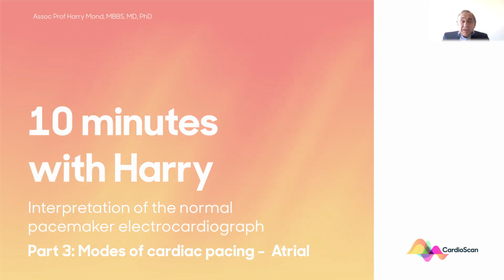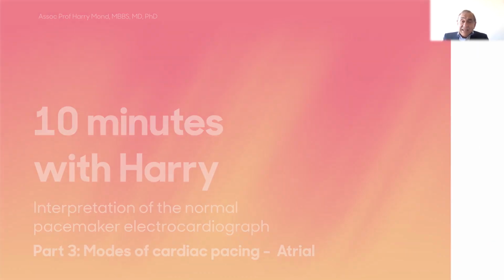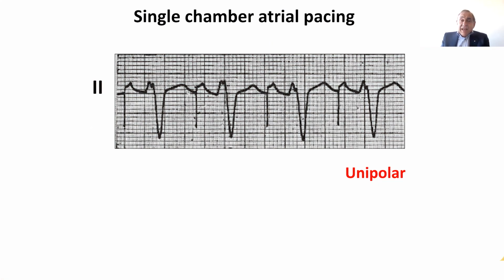This is the third ECG talk on the interpretation of the normal pacemaker electrocardiogram. And today I'd like to talk about atrial pacing. This is single chamber atrial pacing, when we pace the heart without a ventricular lead. The electrocardiograph looks like this.